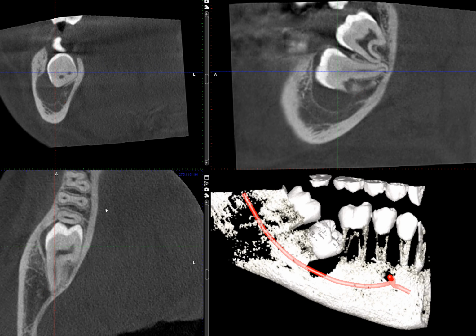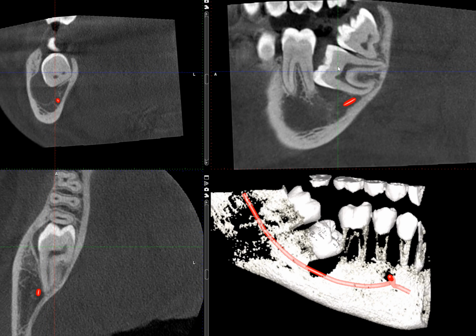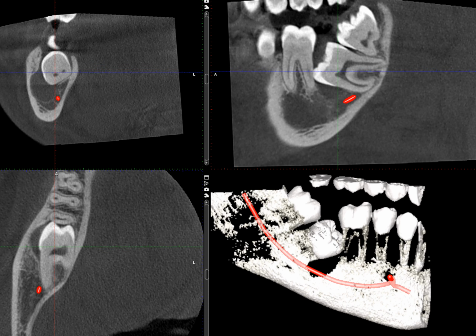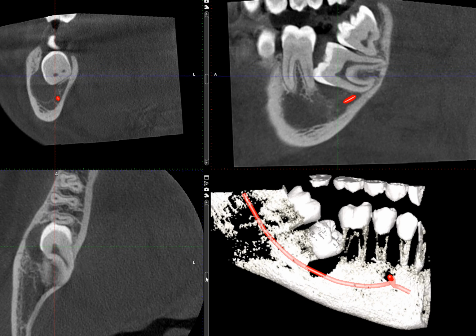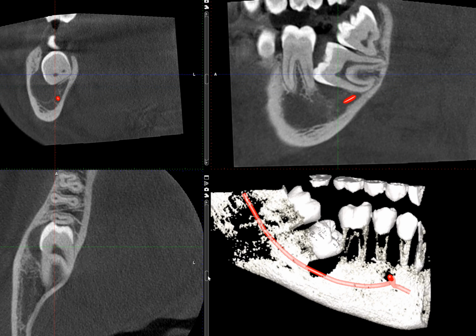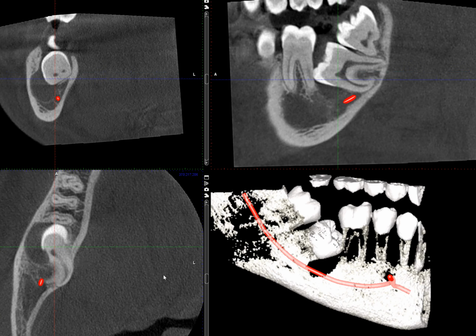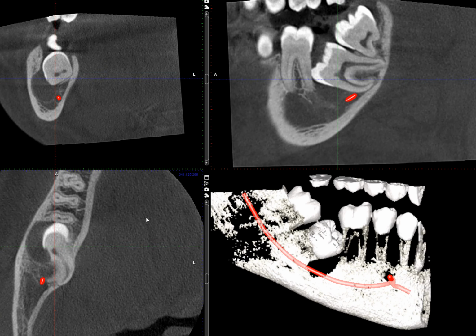It would have been a little bit easier for me to diagnose had this been displaced posteriorly, but there was no evidence of it being displaced posteriorly. So at the time, when I first looked at this, in my mind, I certainly considered odontogenic keratocyst, but this came back as dentigerous cyst. So very, very interesting case. And both of these teeth have now been removed.